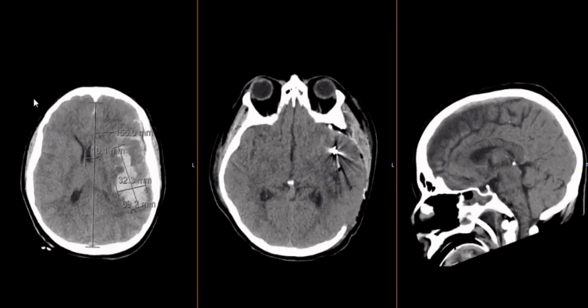And we have that one. When's that? 19th. What was the midline? Actually, it was the midline, the first instance. Which is there.